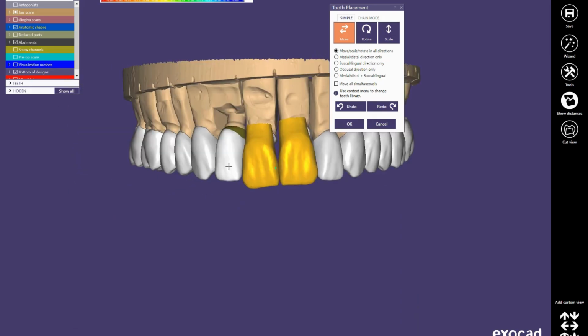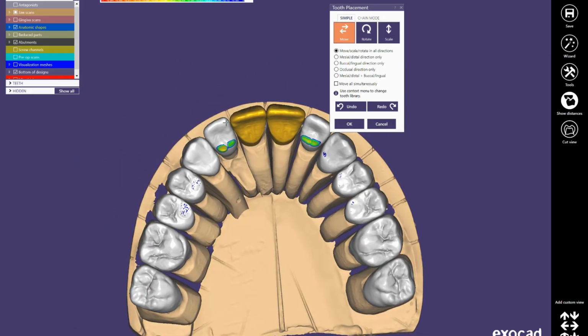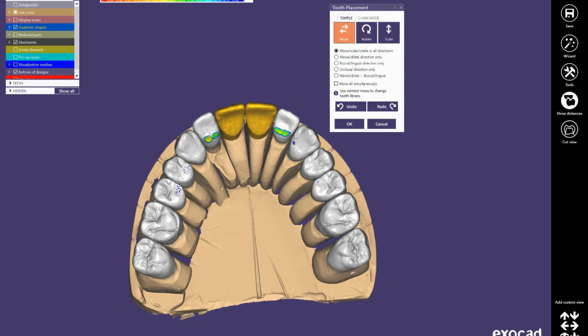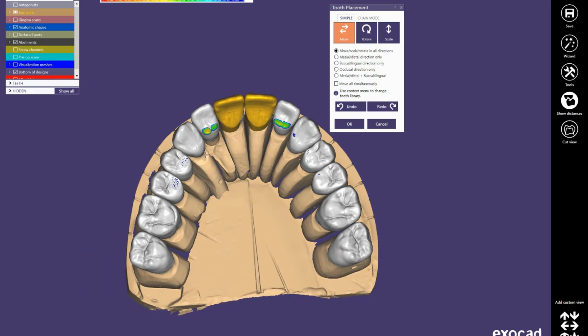So it's a quick video just to show you that for every single tooth, at any step, we have the opportunity to change our teeth library and replace it with a new one. Okay.